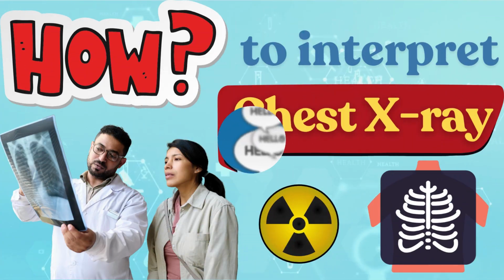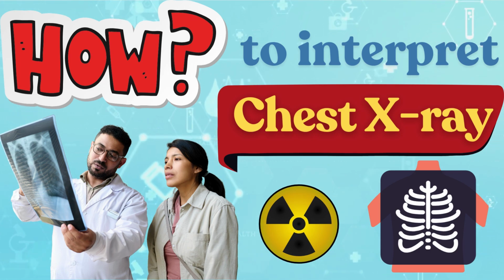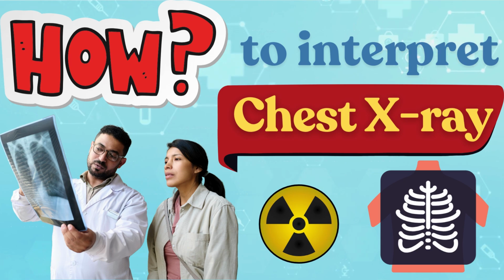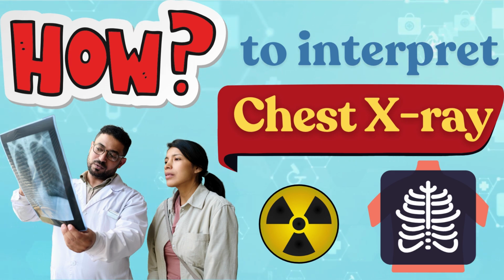Have you ever wondered how healthcare professionals interpret chest x-rays? Whether you're in medical or nursing, radiology, or someone curious about health imaging, you've come to the right place. Today we'll break down how to interpret a chest x-ray, step by step, in a way that's simple, yet comprehensive.